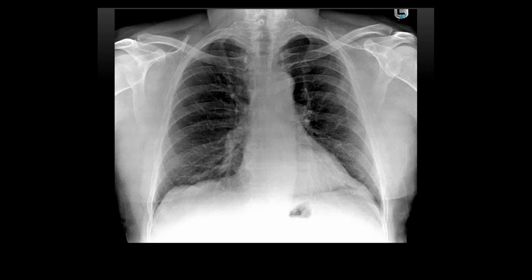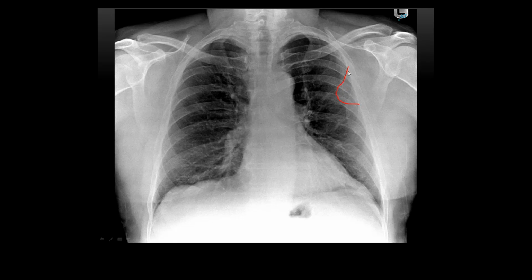So, can you all see this here? Can't really appreciate that well. But if you look, try to draw around it. Can you see that? Yeah. So there is some opacification in this left upper zone.